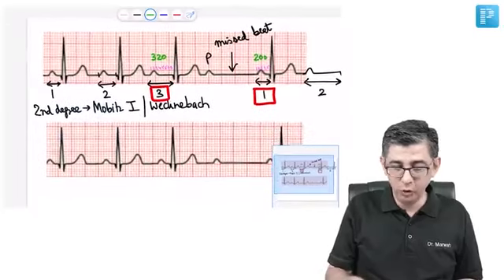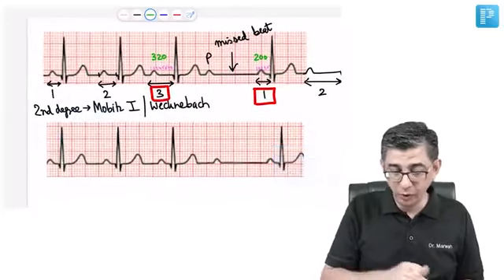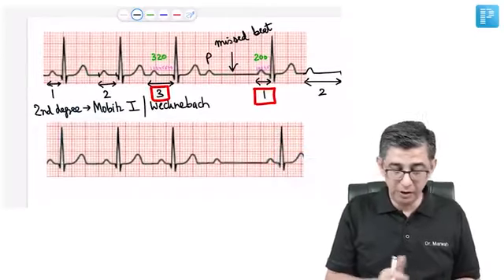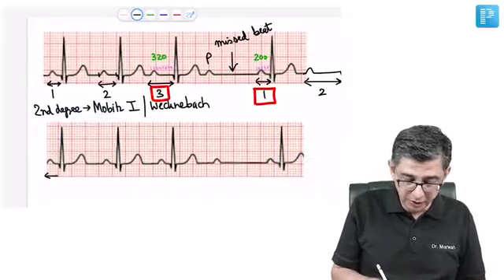So the PR interval of this patient will show a marked variation before and after. And now I would like you to be even more careful and compare the PR intervals in the next strip that I'm showing at the moment. Even if I don't zoom in, you will agree that the PR interval, the first time, the second time, the third time, they look almost equal.